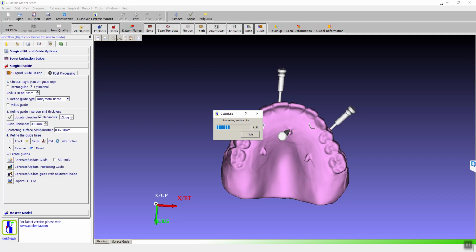And then I would go manufacture that as acrylic or PEEK temporary? Yes, exactly. Actually, in my machine it's got a big hole in it, I'll use the temporary cylinders. Yeah, actually on my system, it doesn't say I have the right license here. In your system, you can check.